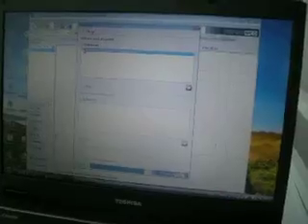This is an export function, which makes an export of the selected patients. As a first step, you should select the user from which you would like to export the results. Then you should select some or even all of the patients under that user. And as a third step, you can define the time range in which you are interested. Now I would like to export all the measurements of the selected patients.